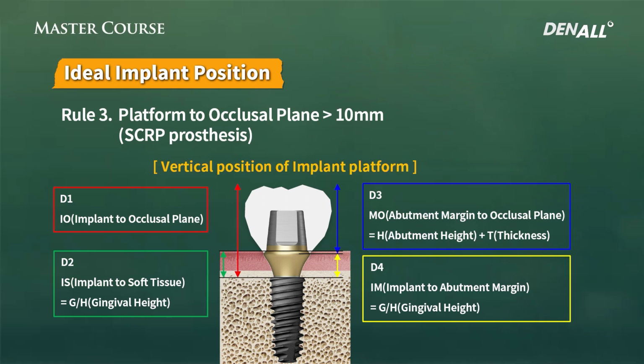After surgery, during model evaluation with the technician, this can be recognized. If you use guided surgery on the program, as you align or position implants, we can measure the distance from the implant platform to antagonists and the soft tissue surface easily, so we can plan in much more detail.